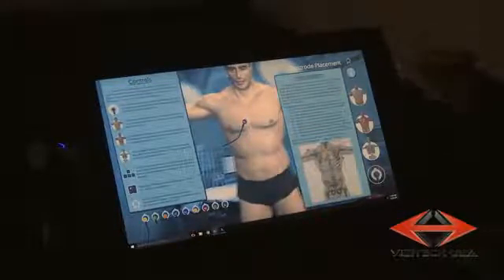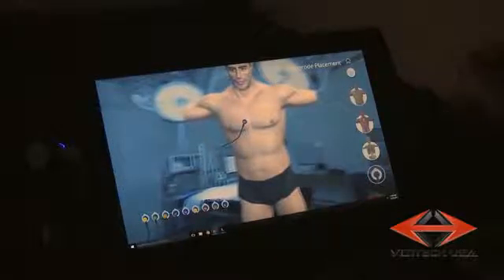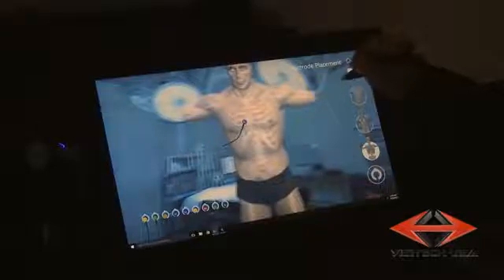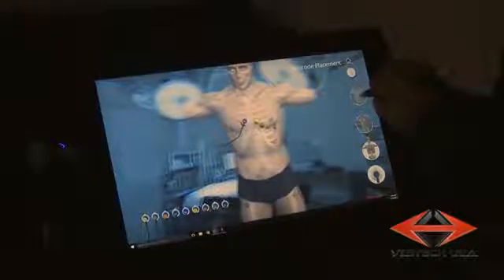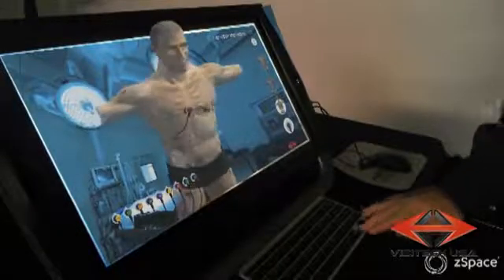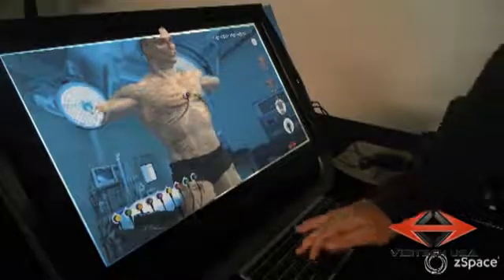So whenever we look at the application, the clinical instructions show us where to place those. We turn these indicators off. We can now see that if we turn off skin and turn off muscle, that intercostal space is now there from 1, 2, 3, 4. And if we turn on the indicators, we can see that it's almost right on top of the indicator where it goes for V1. If we were to tilt the individual, we can see by tilting it where those electrodes are placed spatially on top of the individual.